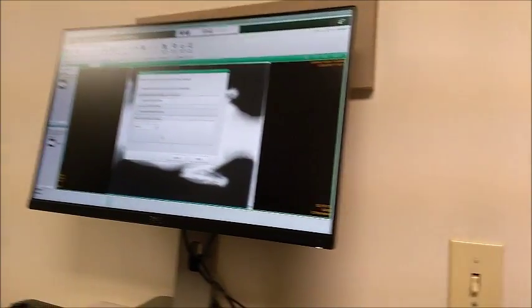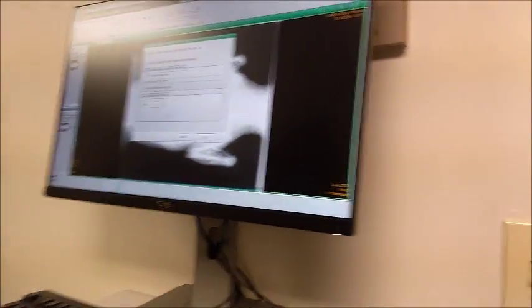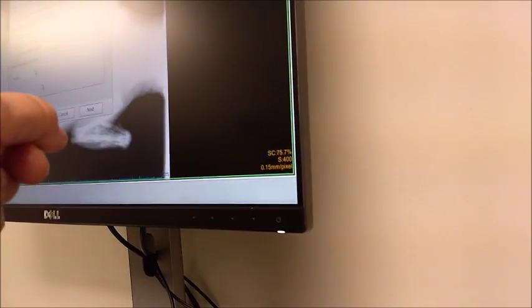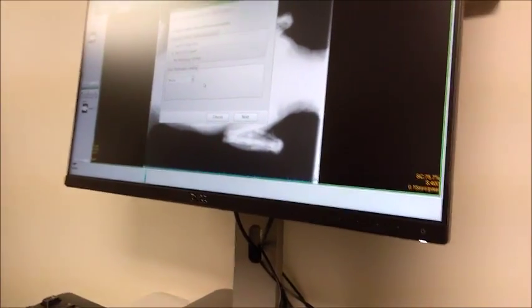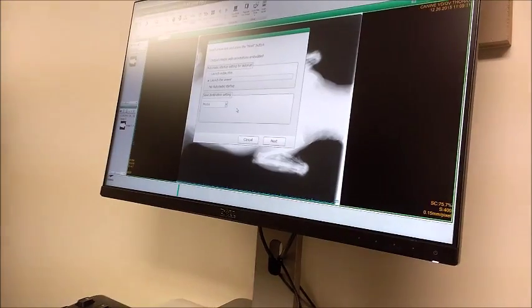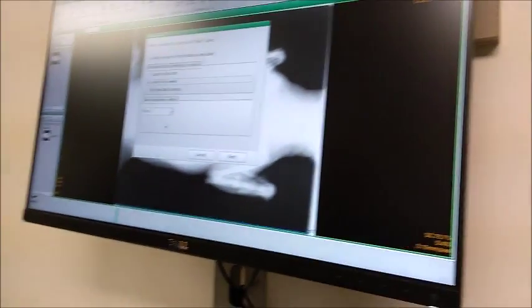Are you talking about viewing the disc, or are you talking about writing to the disc? Writing to the disk. So that's misleading to my brain. This is defining what the owner will see when they take it home and put it in their drive. What'll happen when they put it in their drive? In other words, what automatic startup setting do you want to have for the person that's taking the CD away?